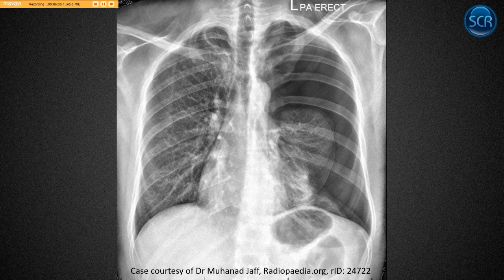So here's an example of someone with a pneumothorax. And so pneumothorax is when you get air outside your lung. So either you have some kind of maybe little tear, microscopically. But in any case, this is a really, really obvious case, because we should have normal arborization of lung vessels out here. And in this case, that stops. So this is actually the edge of the lung. This is the visceral pleura. We'd expect to see vessels here. We don't see vessels. This is pneumothorax.